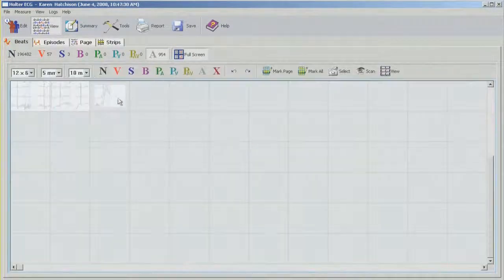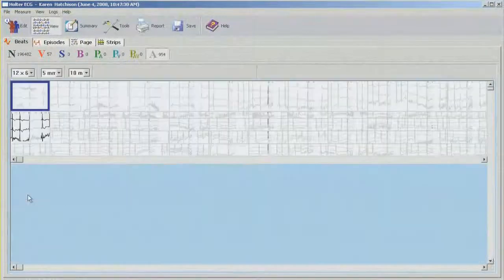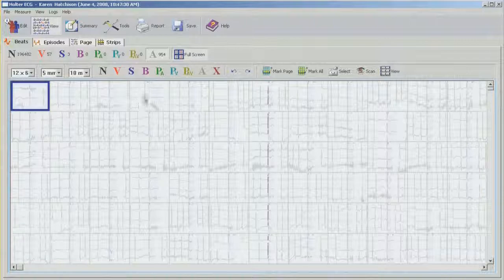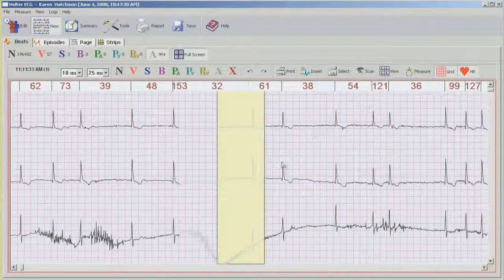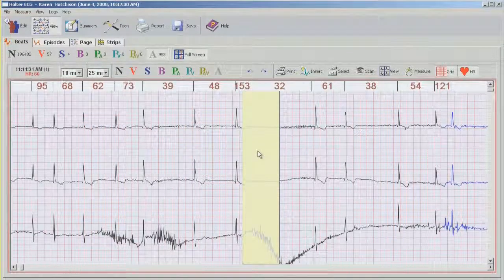And I think this is it for our long pauses. I'm not really concerned with any shorter ones, but I wouldn't want to miss any longer pause. Again, change the beat to normal and X or delete this part.